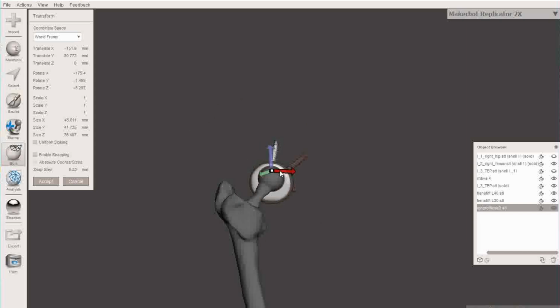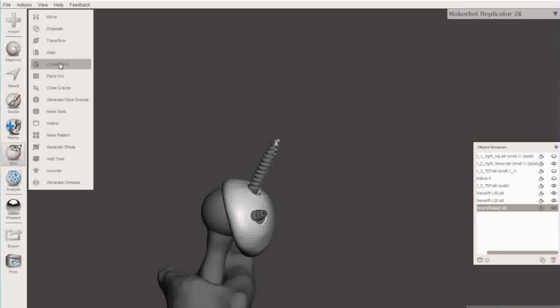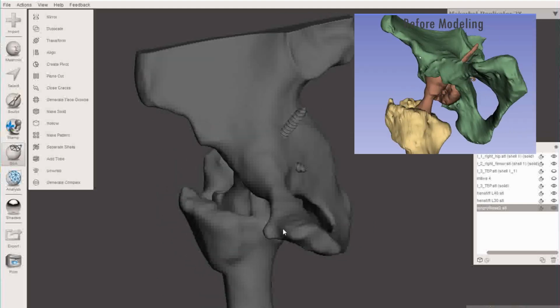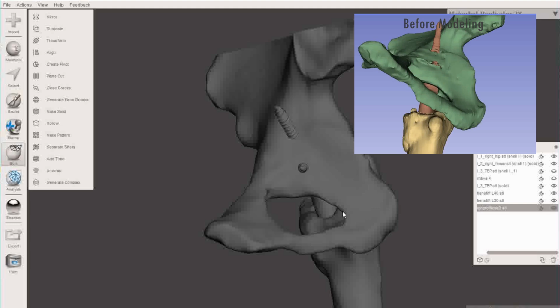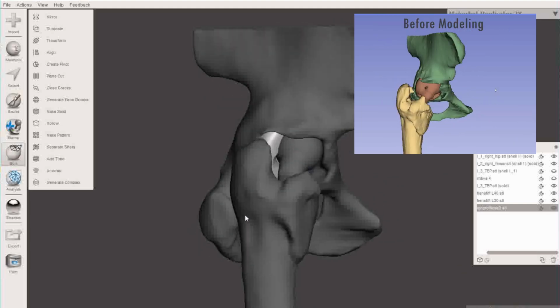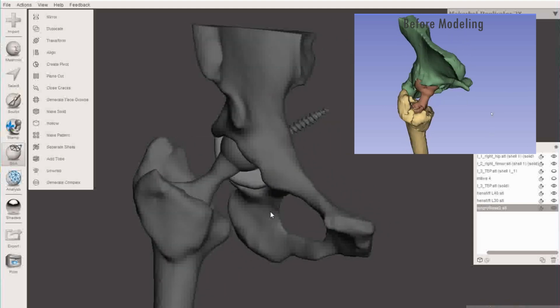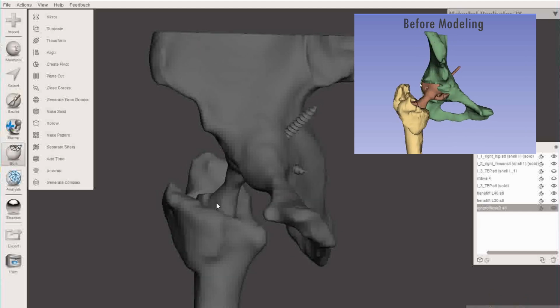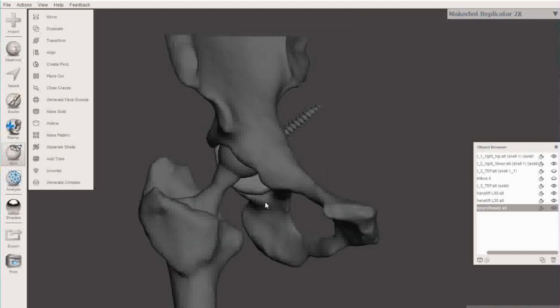The final digital 3D model is now ready for 3D printing. Besides that, it also can be used in combination with AR and VR devices. Remodeling the model took around 40 minutes. As a result, the model now not only fulfills the main requirements mentioned earlier, it also helped to reduce the printing time by around 4 hours.